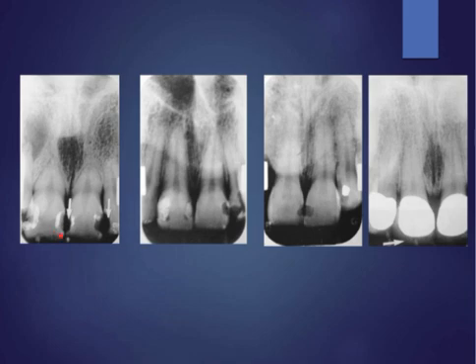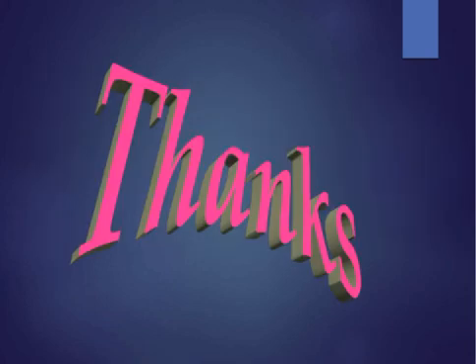Here you have a radiopacity, which is the base, and you have the radiolucency, which is the composite or the silicate filling. That's how you differentiate between restorative materials.